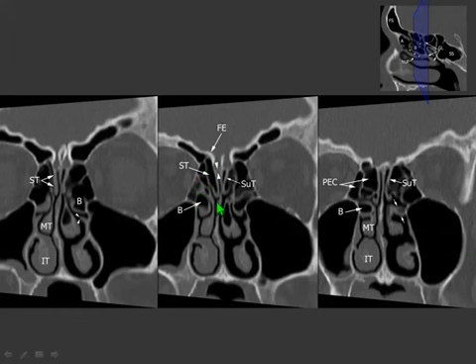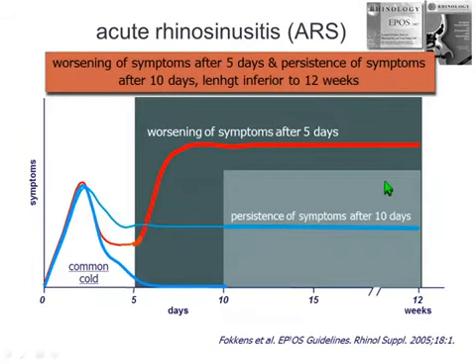We are passing into the posterior ethmoid, and the passage on the coronal plane is made up by the fact that you have the lateral attachment of the ground lamella of the middle turbinate. Therefore, now we are inside the posterior ethmoidal cell. And in some cases, like this one, it is possible also to see the supreme turbinate, a fourth turbinate over there. Well, this is the anatomy, and then we are starting with the pathology in this field.